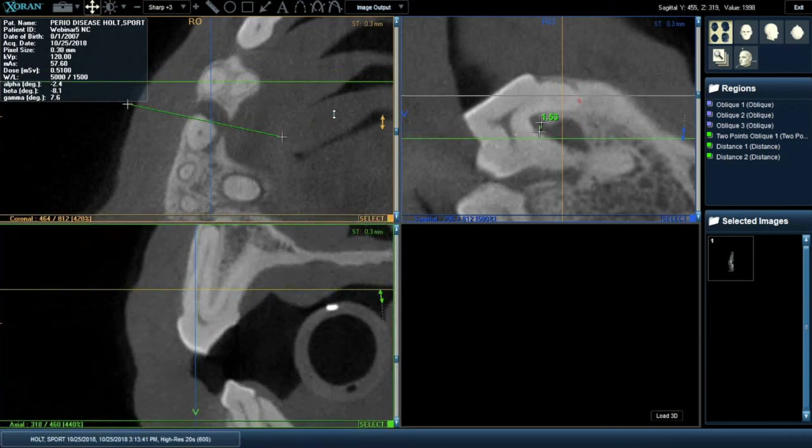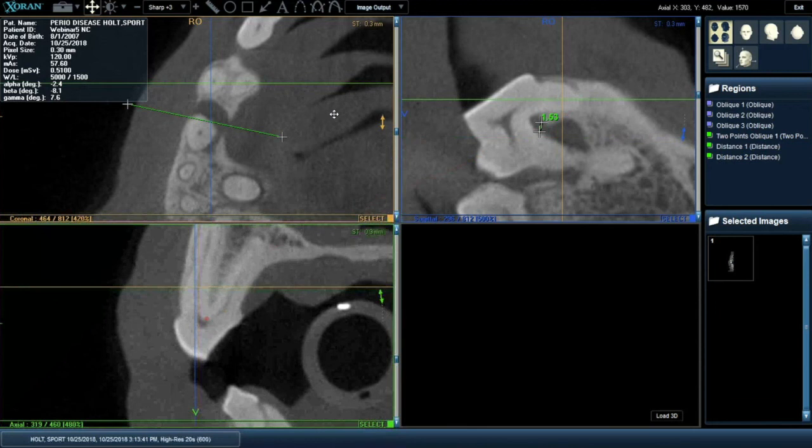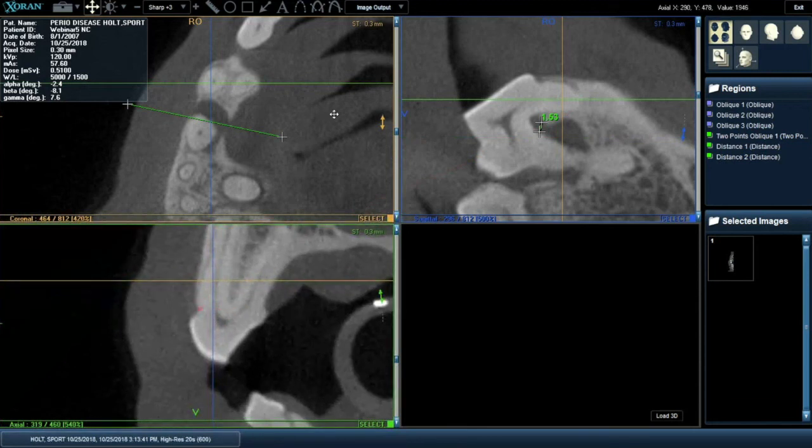Calculus is going to look like the density of dentin. And you would know it's calculus because it wouldn't be where you expect dentin to be. You'd see as if dentin goes over the enamel. It doesn't follow the anatomy of the dentin. So it's sitting on top of the enamel in general, and you'd recognize this irregular shape. It will be very easy to see because of its density.